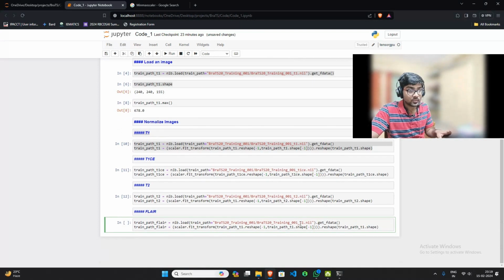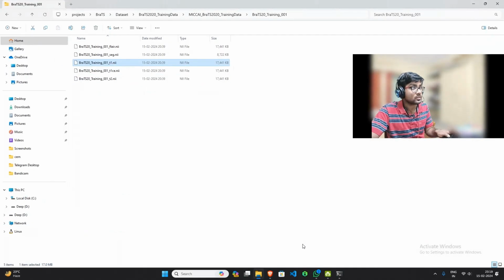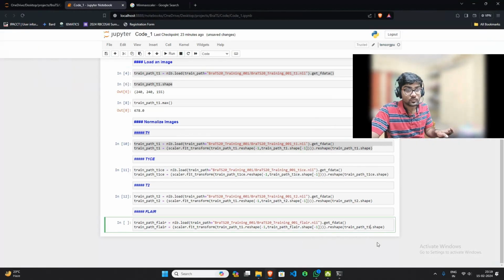Okay. FLAIR. I think all is good. Yeah. So every image of patient number 1 is reshaped.